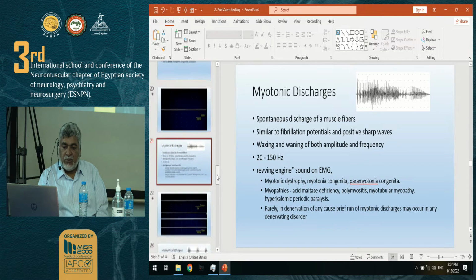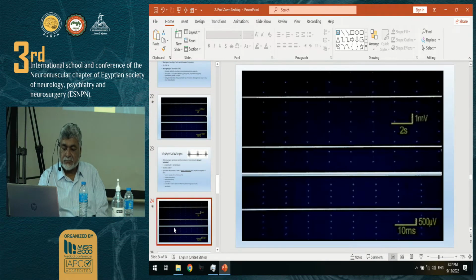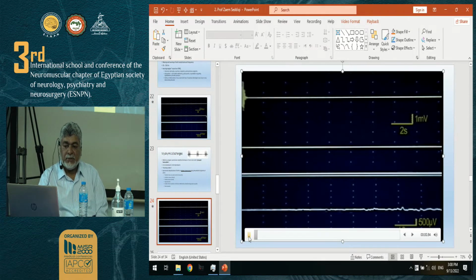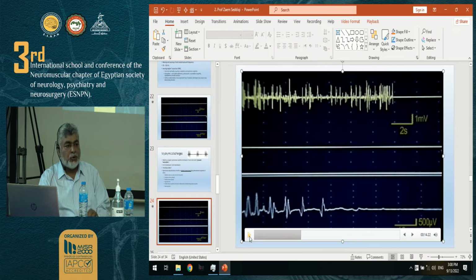What else? Then we go to, I'm just rushing through these slides. Here's something I wanted to show you. This was mentioned in the morning lecture, so I thought I'll show it to you. Here's what we call group discharges. These are called myokymic discharges, okay?